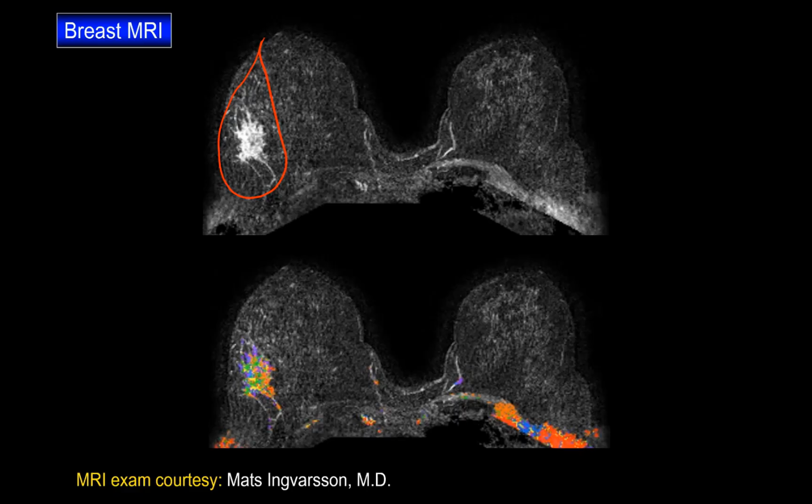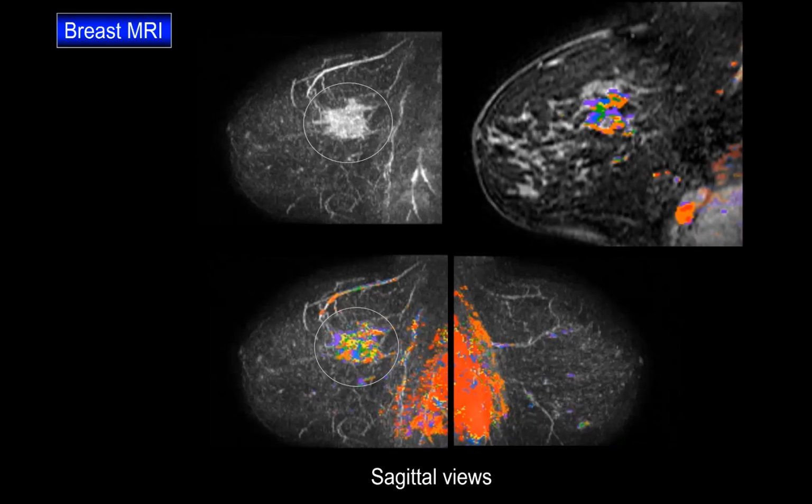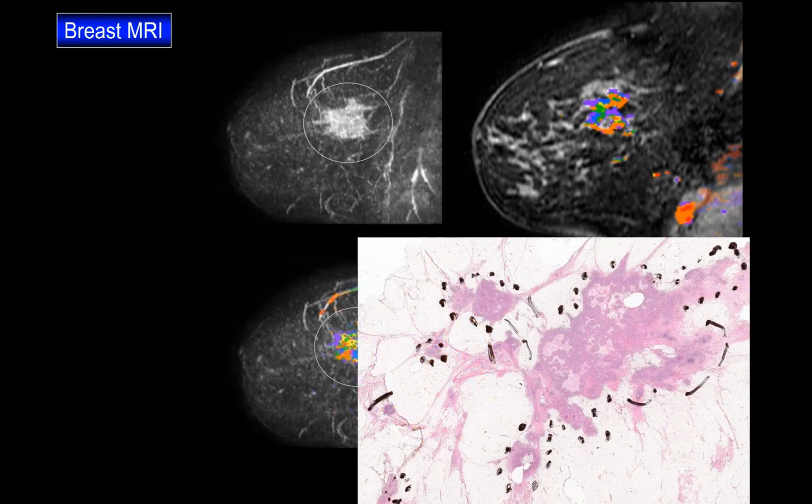Now we are talking with the colleague, the surgeon, and we describe how close it is to the skin. Is it infiltrating the pectoralis major muscle? Question mark, and so on. So the colleagues can make a right decision about the extent of the surgery. You provide all this information, and then it turns out that it's not only multifocal, but also diffuse.